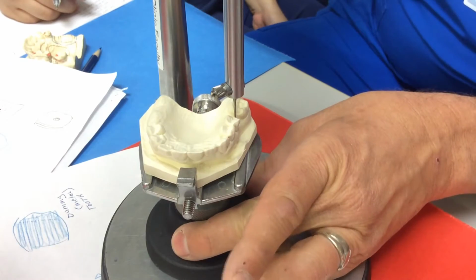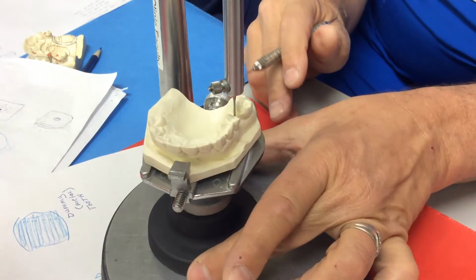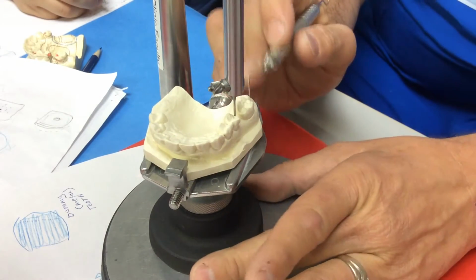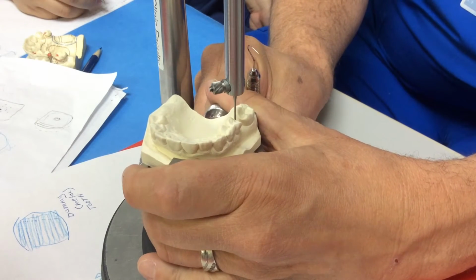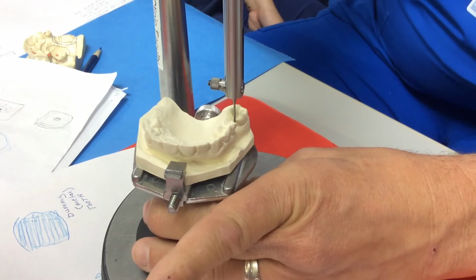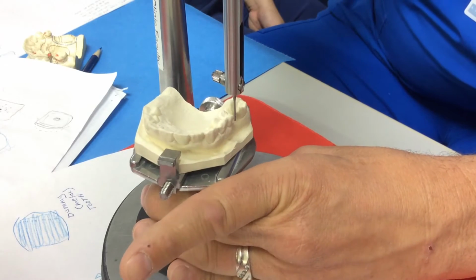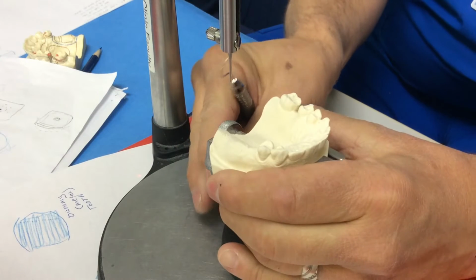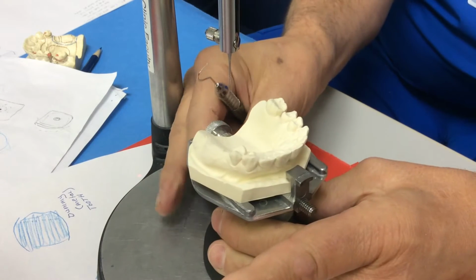When I go to the premolar, I'm good. I don't have any. I kind of want to split the difference in case I have to adjust, but I know the molar's a bigger tooth and I can adjust more on it if I need to. So I'm going to tip it back and I'm going to look. Still have quite a bit. Beginning to pick up some. I'm not, yes.